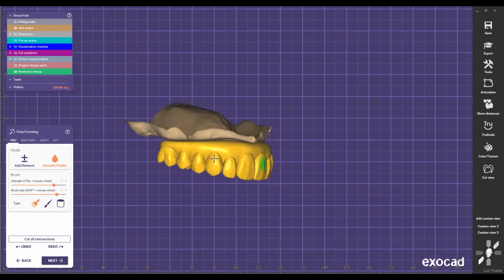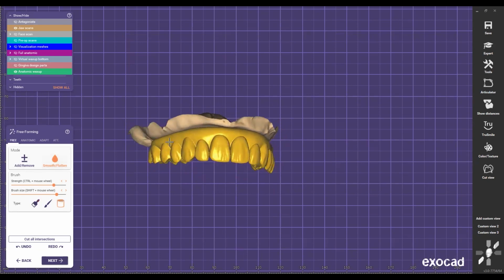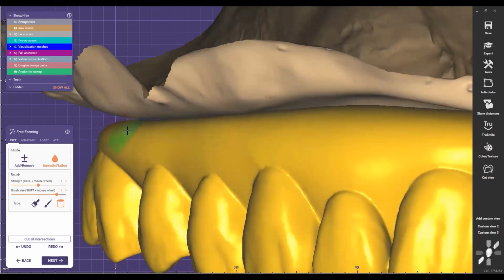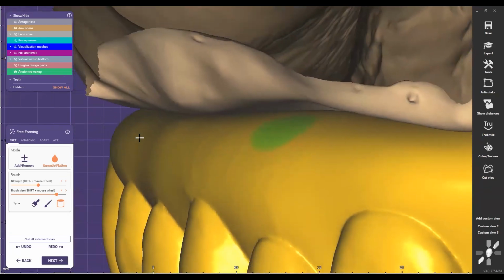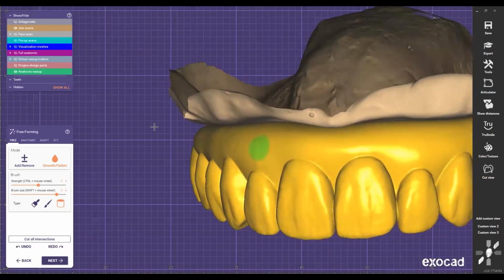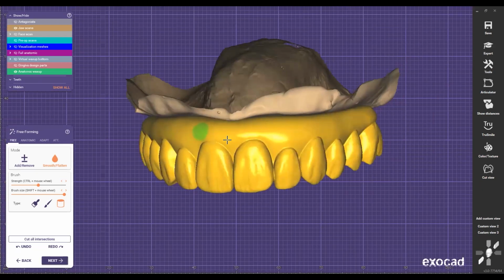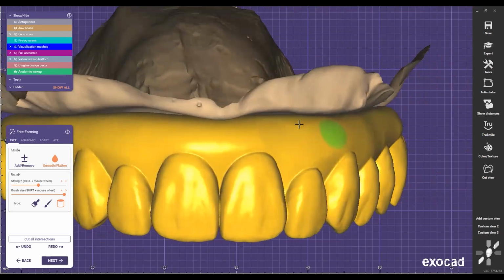So I make it ideal like this, and then from here I can start making little changes. If I know that my tissue is going to have bone reduction there, I need to make this more in, like a nice angle here, right? Make it go more inside, so it's going to save you time when you bring the surgical tissue right here. So now I'm gonna start pushing that tissue in, so it looks much better with the new tissue there. That's why I'm checking from different angles.